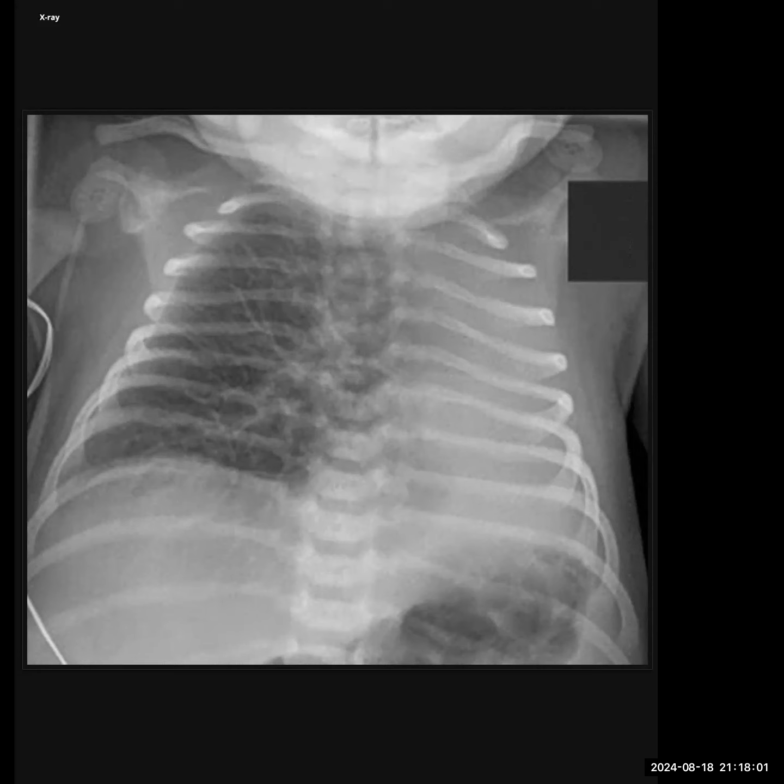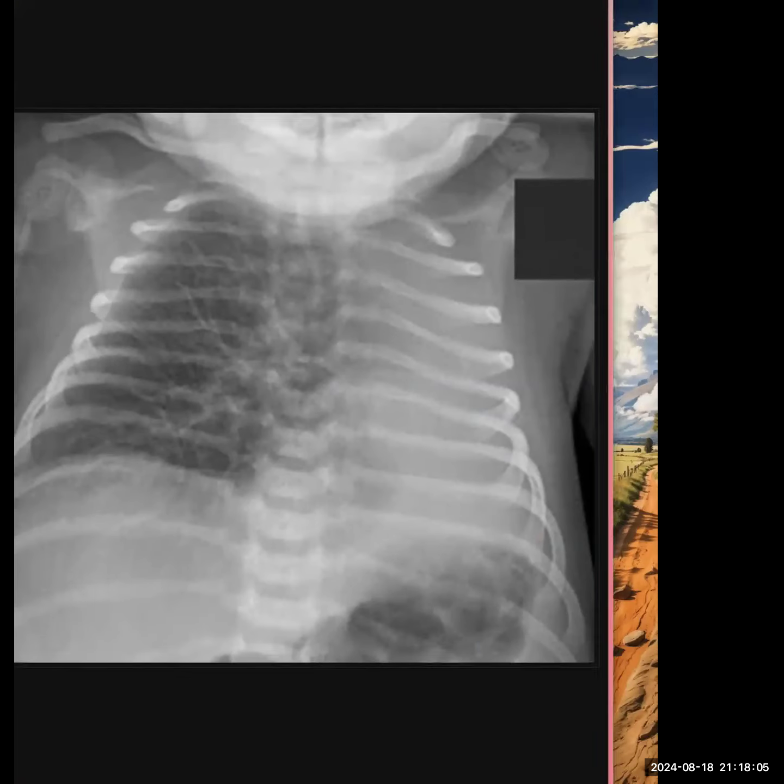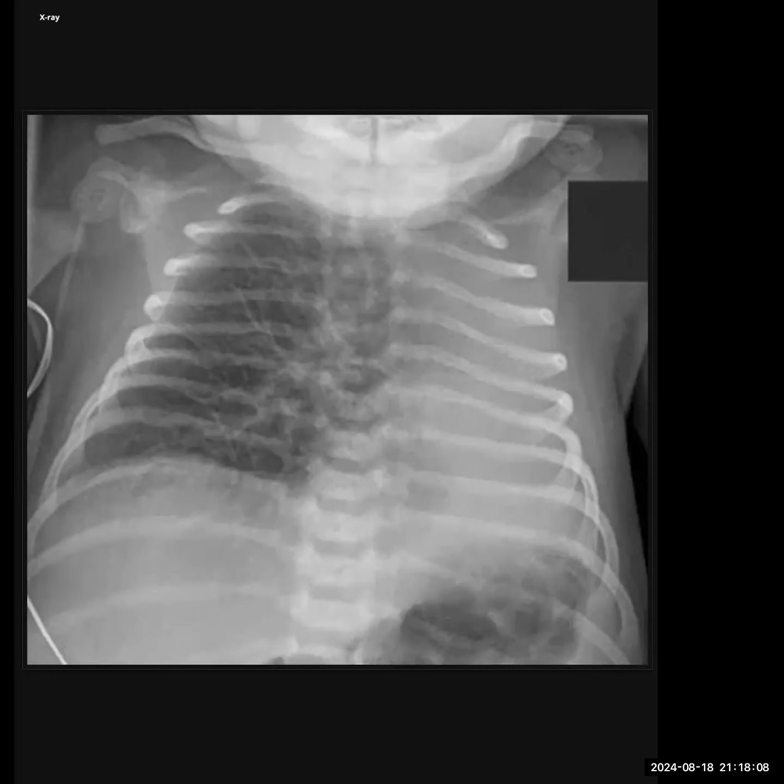I'm trying to assess the age of the patient. I can't see the humeral heads. I think this is a premature patient. I will go with the history also. With this kind of appearance, I'm trying to look at heart borders. I can't appreciate the mediastinal contours or heart borders. I am trying to look for any pneumothorax and pneumomediastinum. I don't think obvious pneumomediastinum or pneumothorax are present.